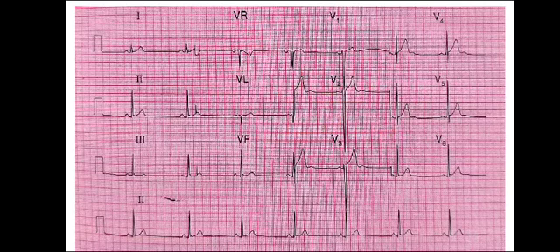There are certain other criteria by which we look into left ventricular hypertrophy in a patient's ECG. These criteria are Cornell criteria and a modified Cornell criteria. What is the Cornell criteria? The Cornell criteria says that the S wave in V3, here you can see, and the R wave in AVL, though here we cannot find a tall R wave, but the sum of S wave in V3 and R wave in AVL, if it's greater than 28 millimeter in men and greater than 20 millimeter in women, this is termed to be left ventricular hypertrophy.